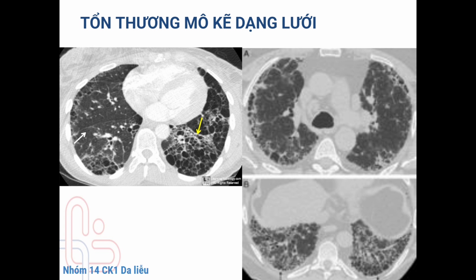heterogeneity, which is prominent in hypersensitivity pneumonitis, bronchiolitis, and chronic thromboembolic disease. Crazy paving, a combination of GGO and interlobular septal thickening, is classically described in pulmonary alveolar proteinosis, but can also appear in ARDS, infection, and diffuse alveolar hemorrhage.